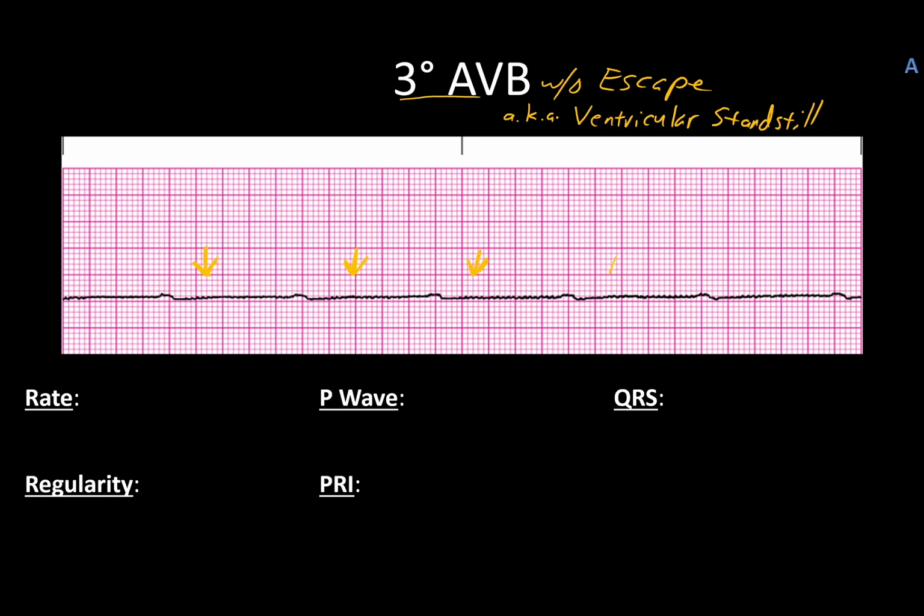Things that would clue you in, of course, is the fact that this is pretty low amplitude. There's nothing that really sticks out as a true QRS. This patient's clinically dead. There's nothing going on that's going to keep them alive at this time. If we worked it out, there's 6 beats across here, so you could do atrial /60, ventricle 0. It is regular, no pattern, and no QRSs.